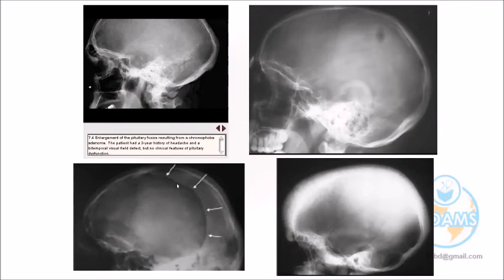This is a bigger X-ray. You see? This is acromegaly. And this one, look at the pituitary fossa. It is disrupted and bigger in this area. The posterior clinoid process is not intact. So more likely this is a pituitary tumor. So there are four important skull X-rays.